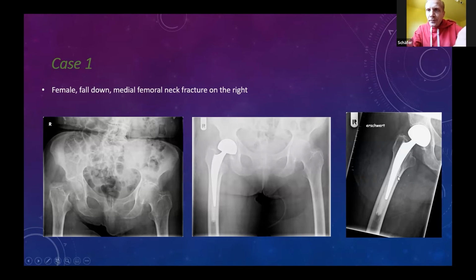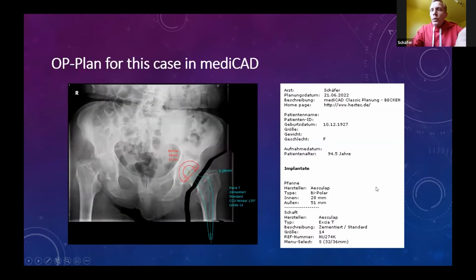Next slide. In every case, every day, we make an OP plan. We plan on the other side because the right hip had the fracture.